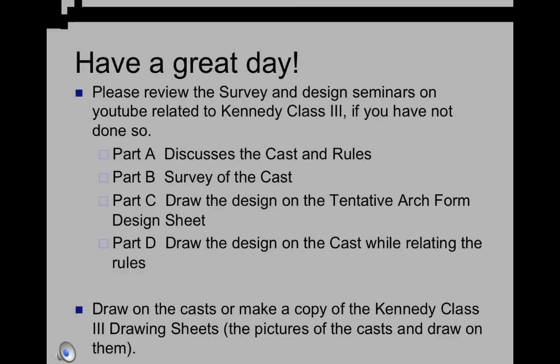This has been a review of one of the casts for the Kennedy Class 3. If you did not do well on the exam, then you might want to review the survey and design seminars on YouTube that are related to the Kennedy Class 3, if you have not already done so. A list of the video links is included on the next slide for the Kennedy Class 3. Also, drawing sheets have been included.